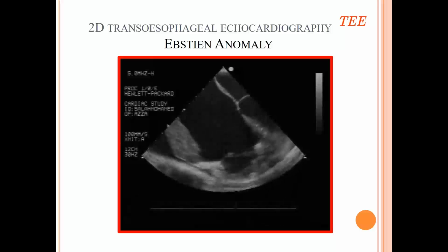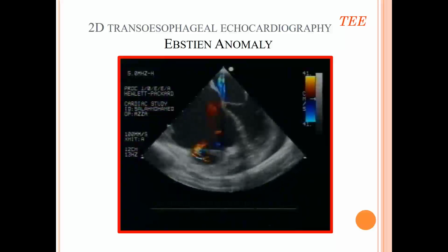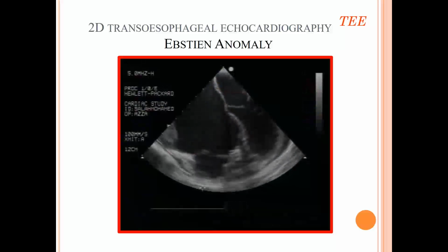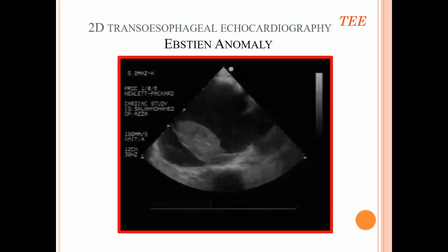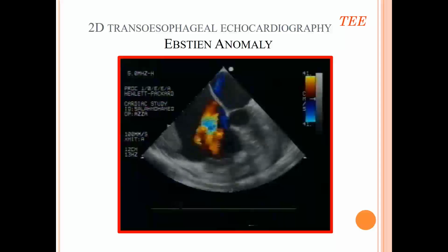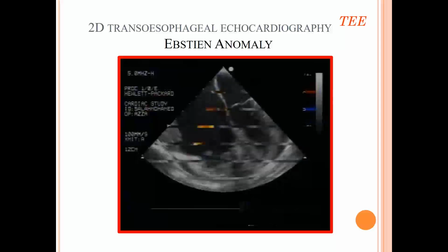Again, masses. This patient was 40 years old, presented with dyspnea, and as you can see, this is a case of Ebstein anomaly, with significantly displaced tricuspid valve and small right ventricular cavity. Not only this, but there was a big thrombus in the right atrial cavity, and the dyspnea was due to repeated showers of pulmonary emboli. He also had a massive anterior pericardial effusion, which was also surrounding the rest of the cardiac chambers, but it was mainly anterior.